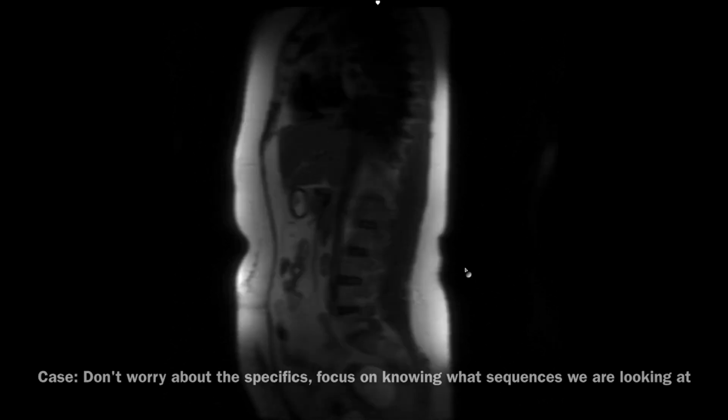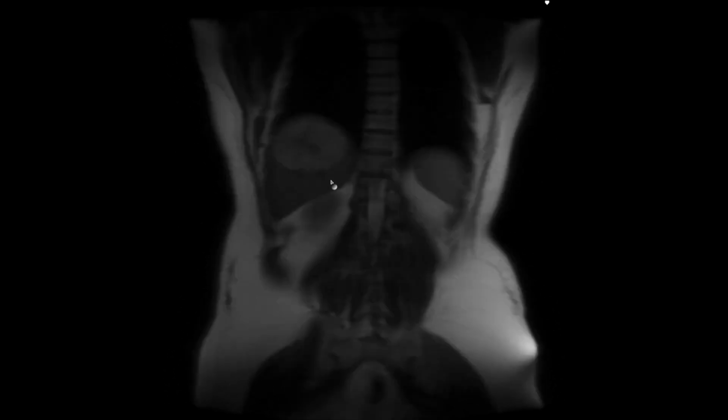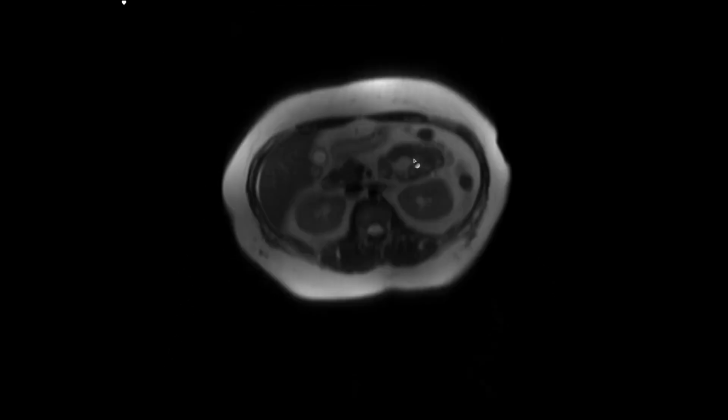These are the localizer images, so you can see that they cover more ground, and you can see more things. You can see that there's some cystic lesion here in the pelvis, for example, and already you can see that there's something that's quite big in the liver, so we'll get to that in a sec.